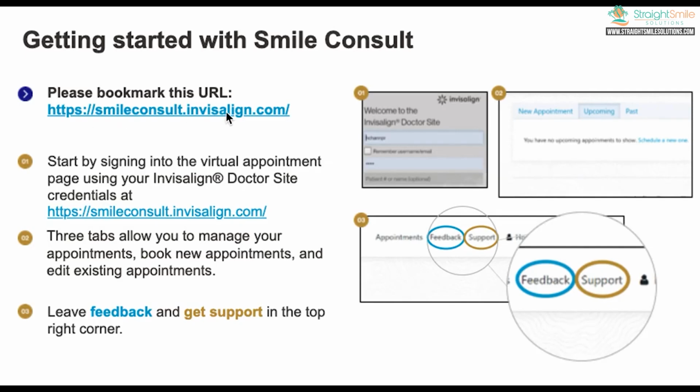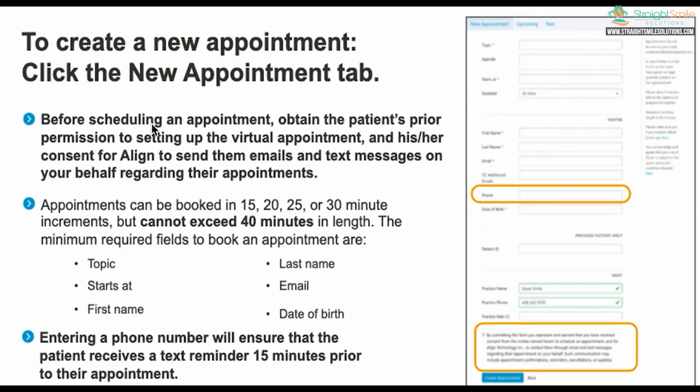You're going to have to bookmark this URL. You're going to have to accept the terms and conditions for both the virtual and the Smile consults. I've already done that and it's still not okayed or set up yet. So it takes a little bit of a while to do it. You can go ahead and create these virtual appointments. You can say how long you're going to want to do. It can't exceed 40 minutes.